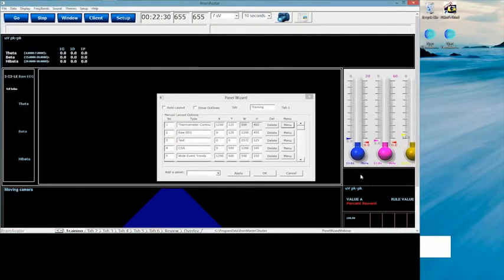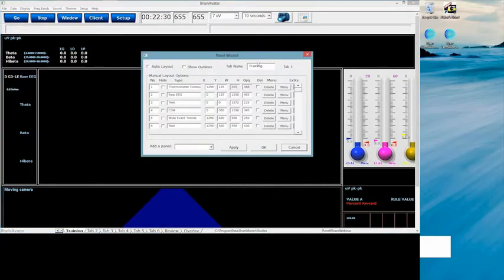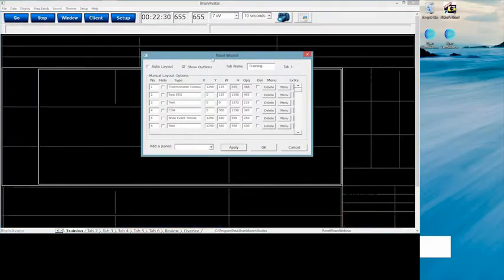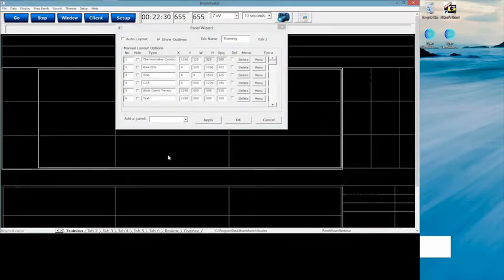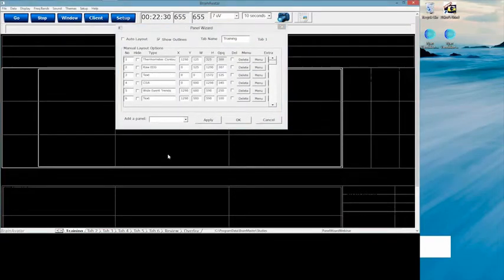Well, look at that. That gives us a lot more room versus the other ones. So what this now will allow us to do is to shrink this down a little bit and give us that room all over the place.